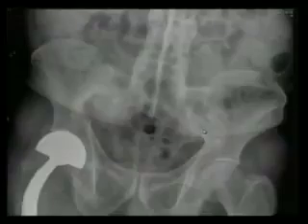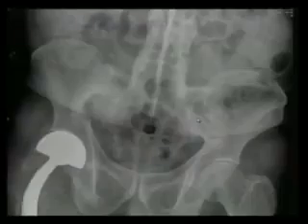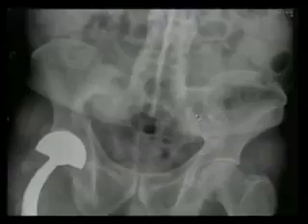If you have sacroiliitis, I just asked some of y'all this earlier, we have a lower half of the SI joint, we have an upper half. We have an iliac side, we have a sacral side. Which side and which half does sacroiliitis affect the worst? Iliac or sacral, upper or lower half? Two-part question.